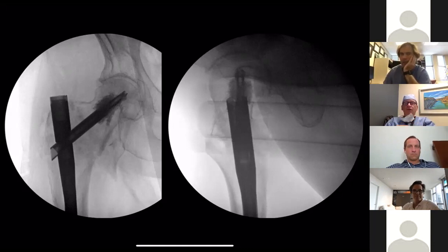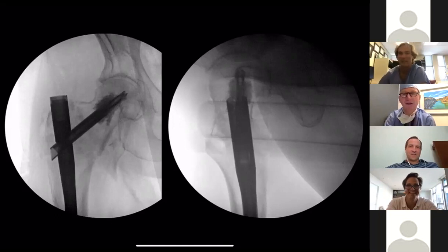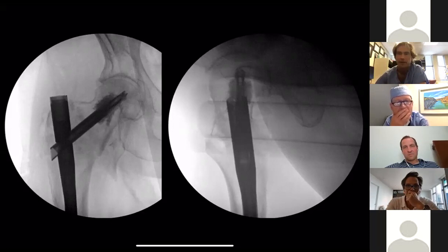Okay. So Tom, you said you wouldn't leave the OR with this. What would you have done differently? I'd reduce it. I didn't say that. I said there's cement in it. Yeah. What about, all right, so you're right here. A number of these devices, regardless of brand, have something where you'll spin a knob and it'll try to drag the blade plus the cement, which is now a more sturdy object. It'll try and drag that lateral. Yeah. Did you try that? Very reasonable. We didn't in this case, but very reasonable. I agree with you. And we oftentimes try to do that to get some compression intraoperatively.